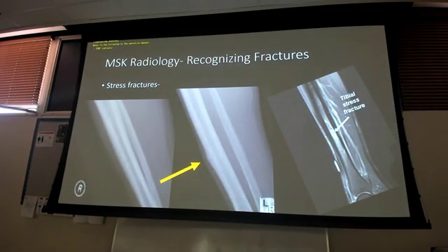The yellow arrow, so again, normal, yellow arrow is the x-ray. Ask yourselves, without the yellow arrow, would you have noticed that fracture? It might be yes. It's not the most subtle stress fracture I've seen, but it's still a really subtle abnormality.